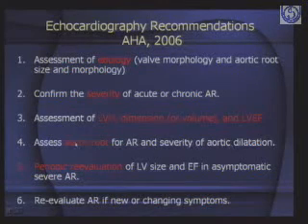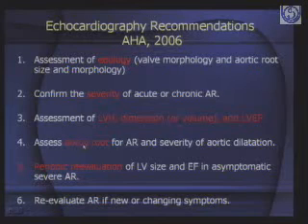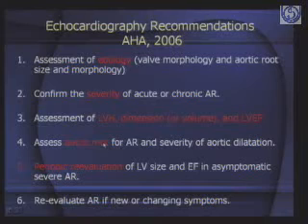Mind you, assessment of aortic root is as important as assessment of left ventricular hypertrophy or function, because if the root is dilated beyond a certain point, then you are not just going to replace the aortic valve, you also will have to think in terms of replacing the aortic root. Periodic re-evaluation, that's where the real strength of echocardiography comes in.